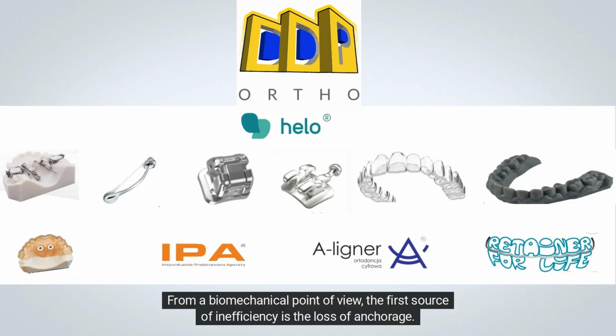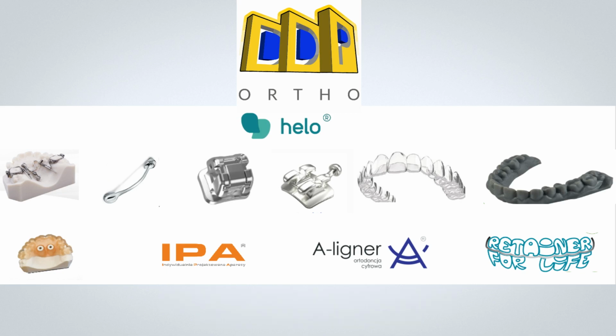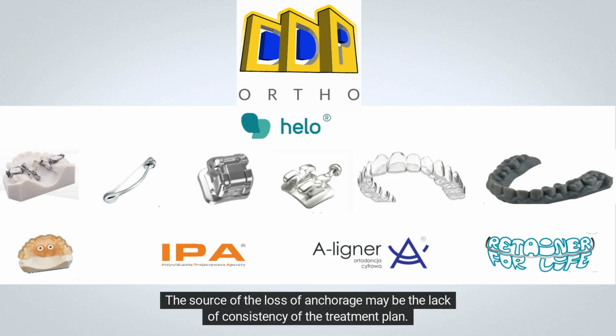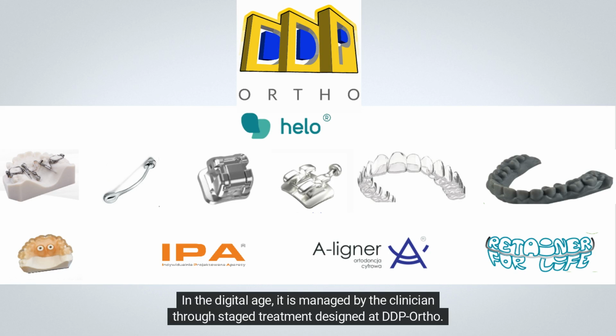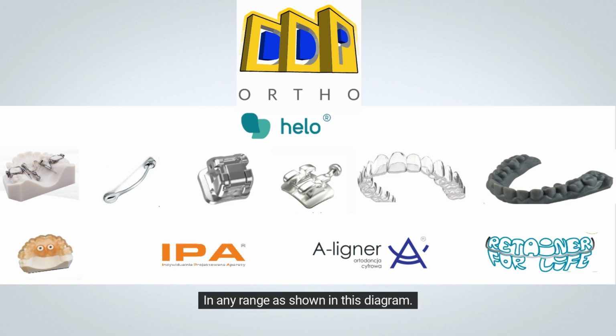From a biomechanical point of view, the first source of inefficiency is the loss of anchorage. The source of the loss of anchorage may be the lack of consistency of the treatment plan. It is difficult to distinguish between active and passive units. This challenge is related to the knowledge and experience of the orthodontist. In the digital age, it is managed by the clinician through staged treatment designed in DDP-Ortho, as shown in this diagram.